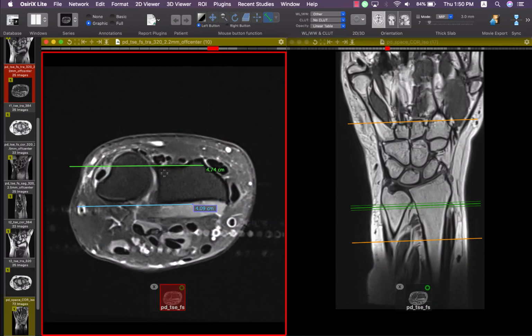If it is in a supinated position, this rule is not applied, and you can see the head is dorsally or ventrally subluxated, and this will not be pathological. It could be normal, because in supination the head can be dislocated or subluxated anteriorly and posteriorly. It is normal in a normal pattern.